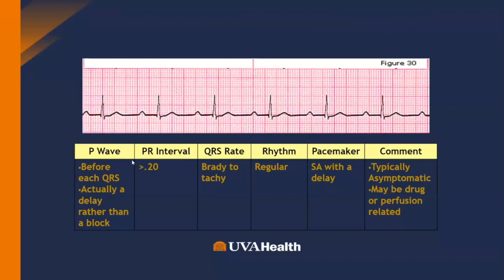Here, we're taking a look. We're starting to get into the blocks. Arguably, I'll tell you, memorizing blocks is almost impossible to do. You really have to intrinsically understand what's going on with blocks in order to be good at them. And it always has to do with the PR relationship. If you can describe the PR relationship of this rhythm, then you should be able to discern which block it is without even looking at the rhythm.